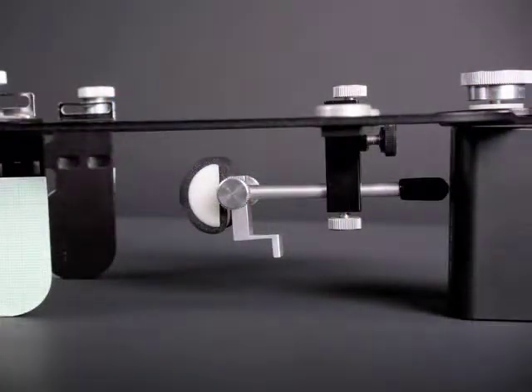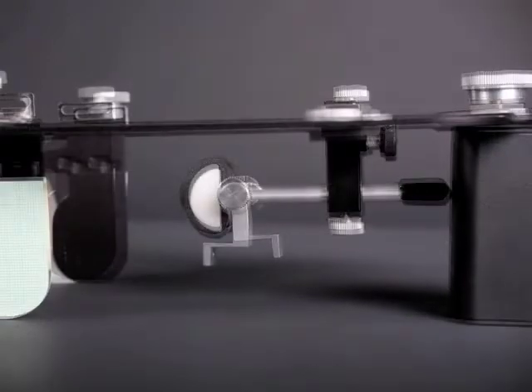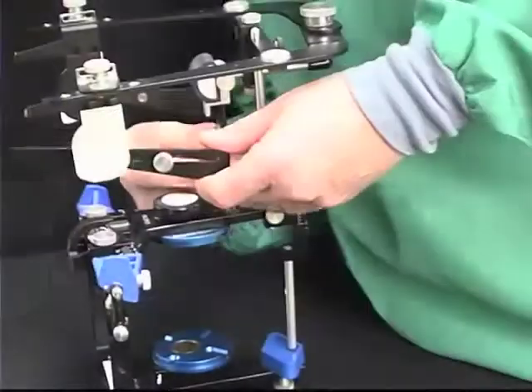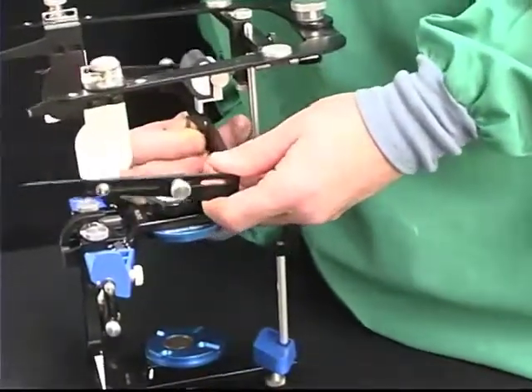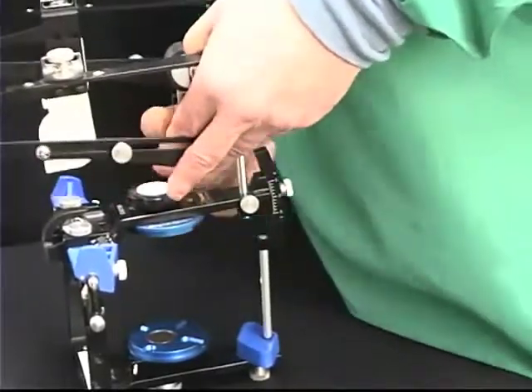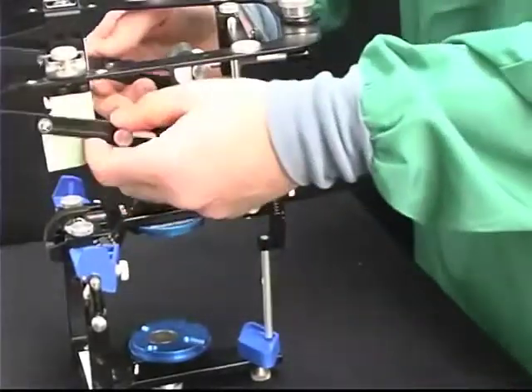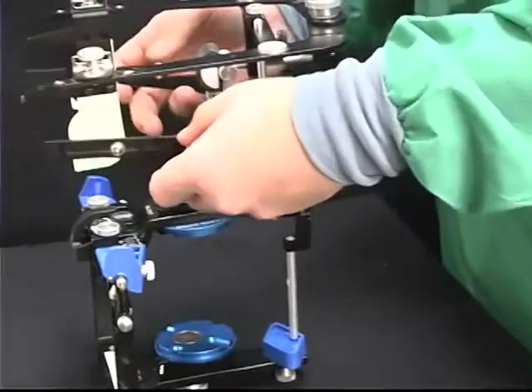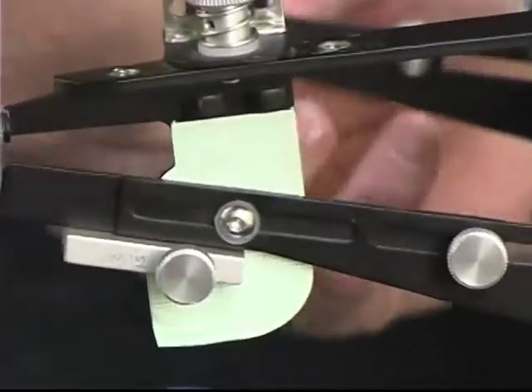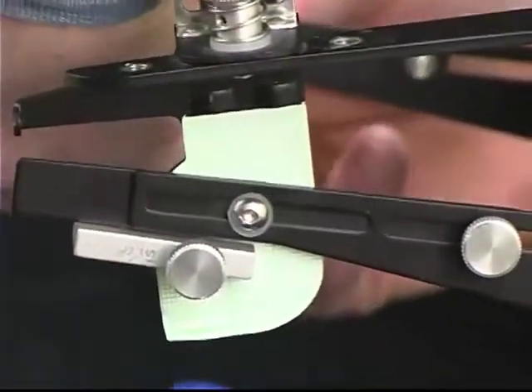At this point, it is also very important to reverse the position of the reference plane support block that was done prior to performing the hinge axis location. Next, attach the reference plane tool to the reference plane support block and attach the reference plane clamps to help line up the plane to the hinge axis location on the graph. This requires multiple adjustments from one side to the other in order to line up the reference plane with its axis point.